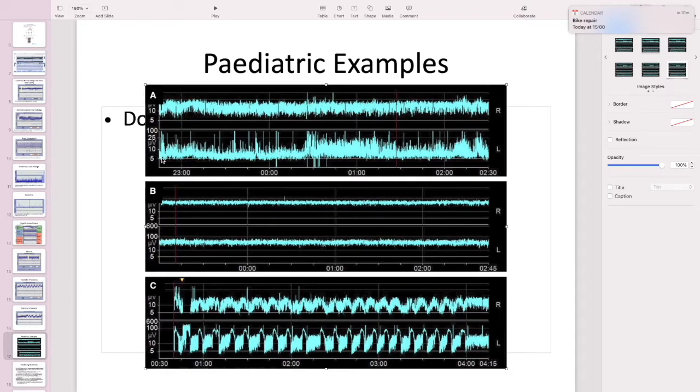So here, okay, the upper border is above 5, above 10. That looks okay, some spikes here. But then it broadens, so it goes from continuous, this narrowness, to quite thick, discontinuous. And discontinuous is a more abnormal tracing. Now I don't know exactly how this fits with the disease progression of this infant, but it is quite interesting that just by putting the aEEG on, you could identify that on the left side of this child's brain, something is going on.